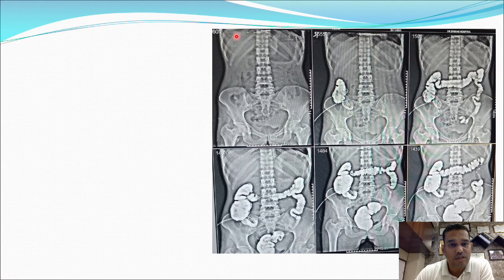I'm able to say it is the abdomen because I'm able to appreciate the ilium bone, and also the ribs and the vertebra. So this is a serial contrast X-ray of the abdomen showing the radio-opaque shadow on the right side. Then this shadow forms the bowel, that is the ascending colon, and is giving a picture of a transverse colon, then the descending colon. Similarly, as the contrast moves forward, you are able to appreciate the distal structure. This is the area of the sigmoid and the rectum.